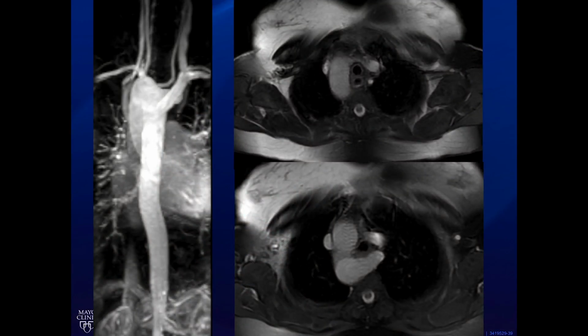You can see it here and coming down here. The only thing I would say on this for children under 5, you do a lot of anesthesia for kids. If you can get MR goggles, that's great. It really cuts down on your anesthesia. I don't know if any of you do pediatrics, but maybe some of your adult patients would like it. MR goggles show movies, and they really cut down sedation.